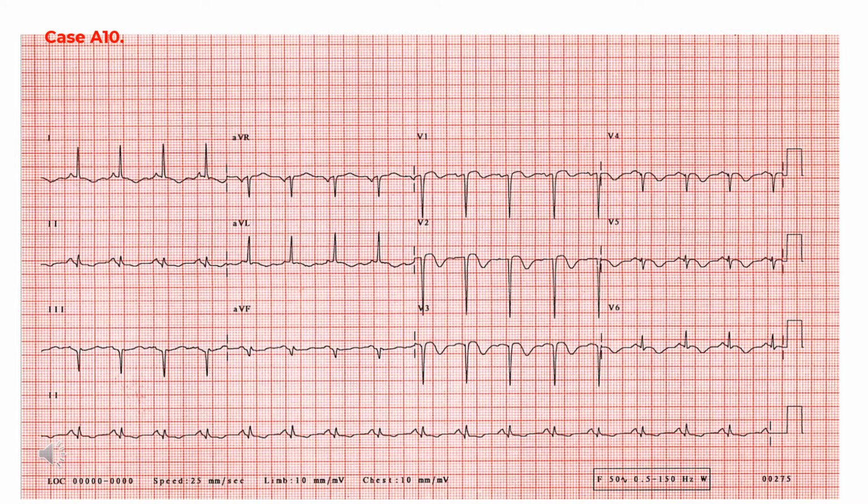There are no Q waves in these leads, but there is loss of R wave in V5 and possibly V6, although it is not possible to be sure without a previous record for comparison with the other evidence of ischemic disease provided by the ECG. These lateral T wave changes almost certainly reflect ischemia or infarction in this territory.